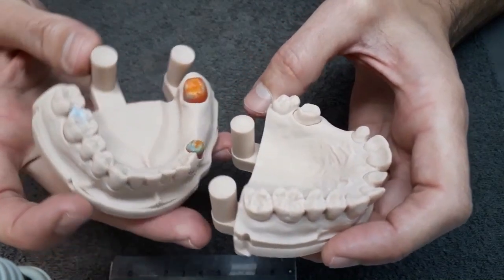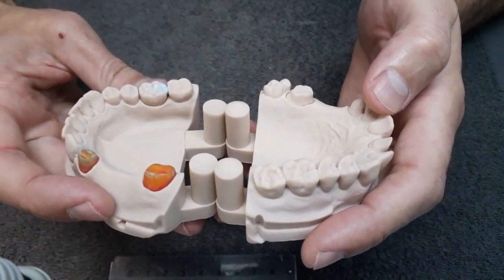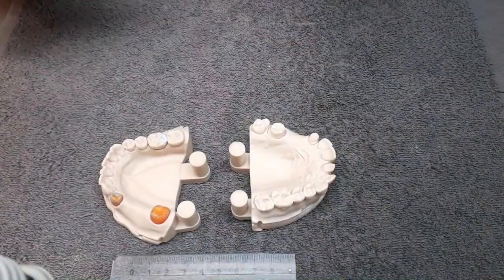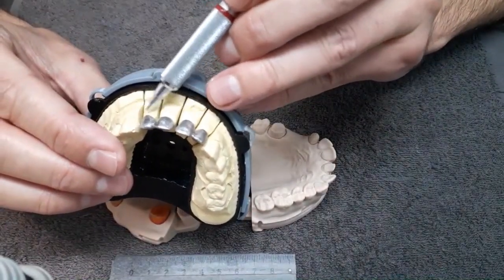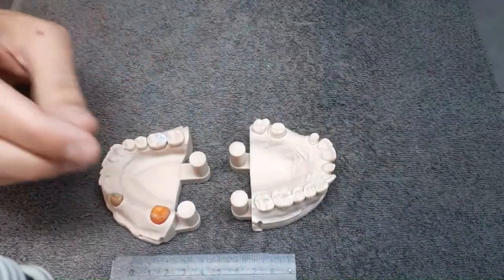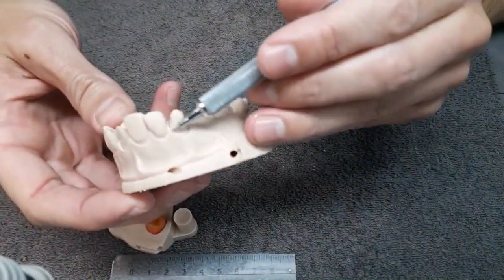The person who invented this type of model that keeps the gum around the die is Willy Geller. That's why the model is called the Geller model. So alveolar models are called Geller models, according to the name of the inventor. You see, in the other case, the gingival papilla had to be cut. Here, you don't have to cut it. You have it there in place.